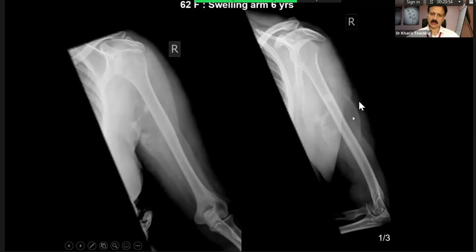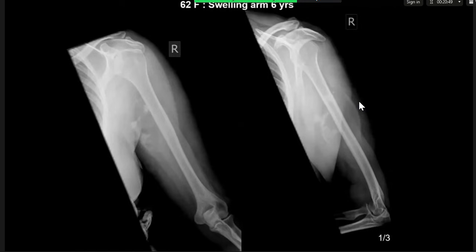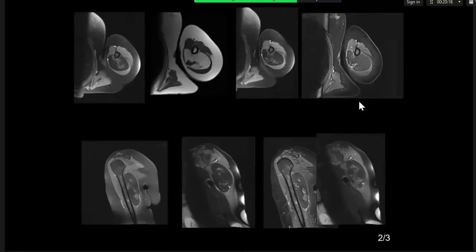This density? So it looks like, if we take it that the entirety of the lesion spans from this curvilinear area of swelling all the way around to this sort of area, that some of it is projecting as soft tissue density, some of it is calcified, but some of it might be fat density. Right. So what are you going to do next? So then I think, especially if this is growing or painful, we've got to be concerned for potentially a liposarcoma. I think an MRI would be appropriate.